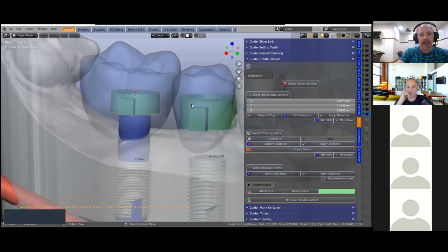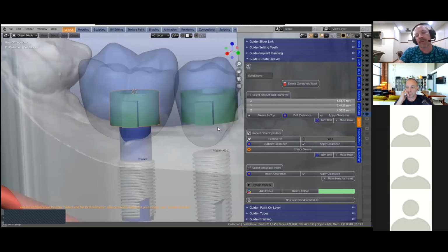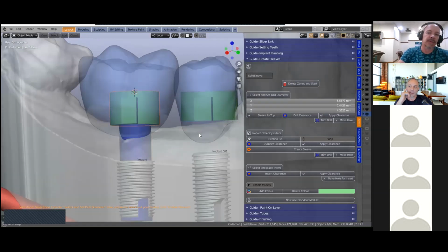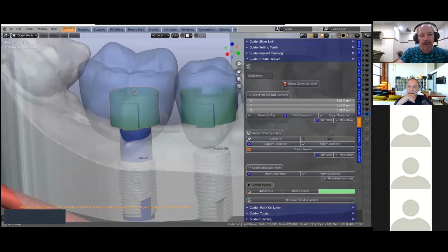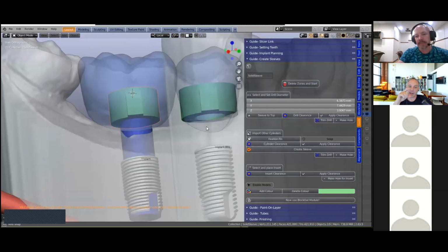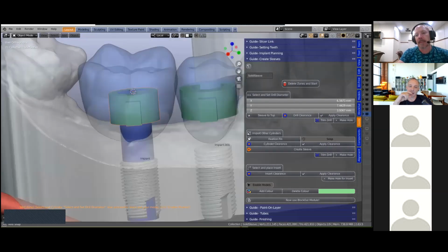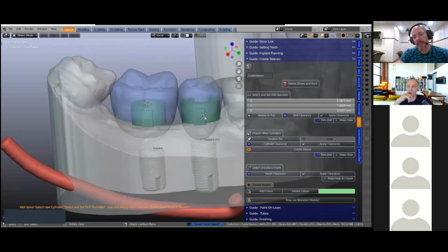So the ideal length is between, well, four is okay, but not longer than 6, because we've got the Steco components, which are the cutting tool for those components. The metal guide sleeves are 6 millimeters. So you might just stay just short of 6 millimeters. Unless you don't use metal inserts, then you could probably go longer.